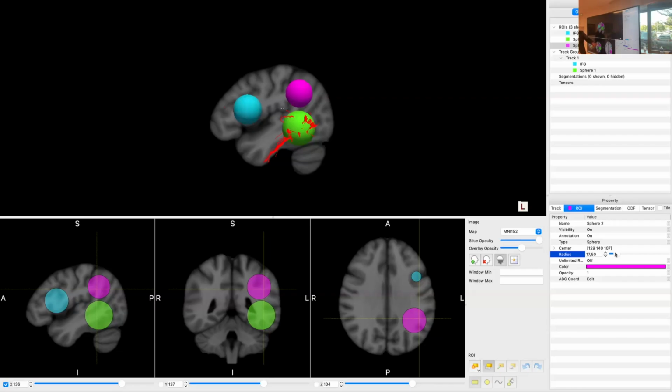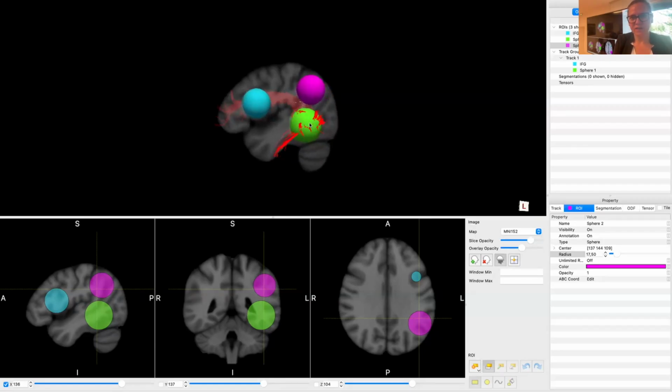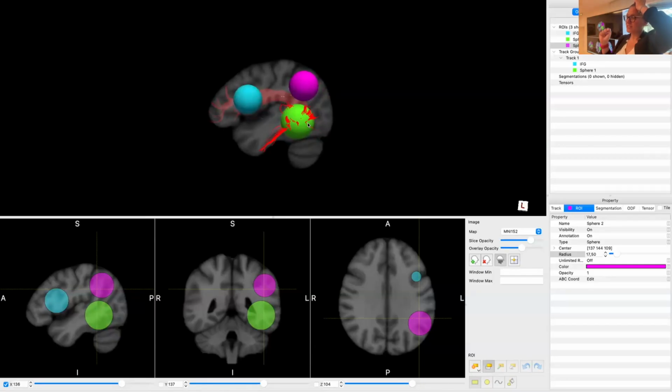Now, I placed my inferior parietal lobe region, but I also moved it deeper than the other structures. Sorry, no, more lateral. So the long segment is the deepest structure, and then the indirect segment is more lateral to it. Okay? And make sure they do not touch with the temporal region. Okay. Now, once you're happy with your region of interest, save.